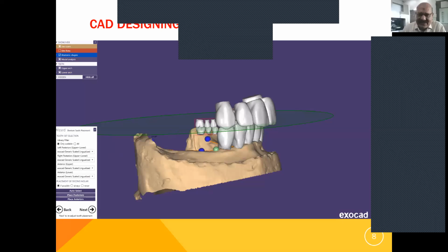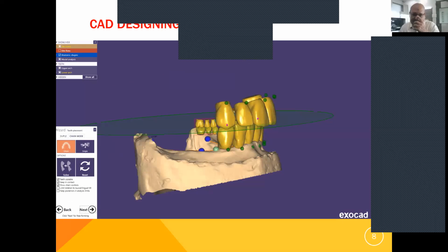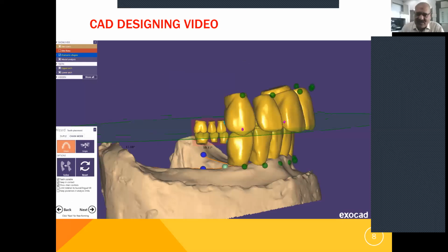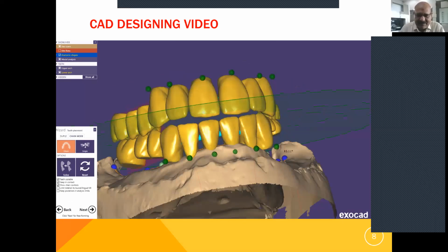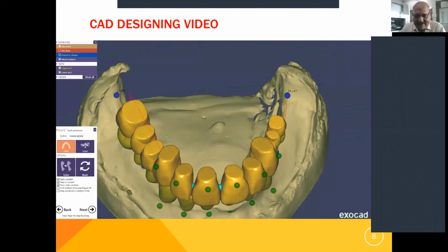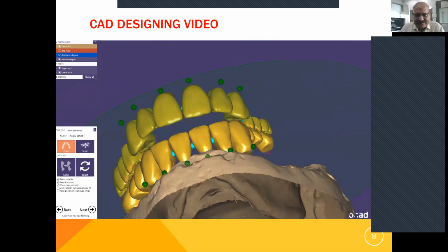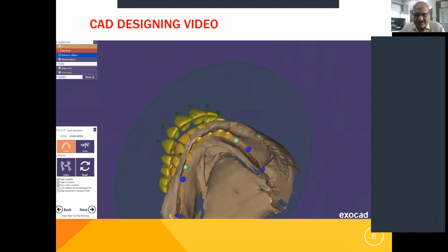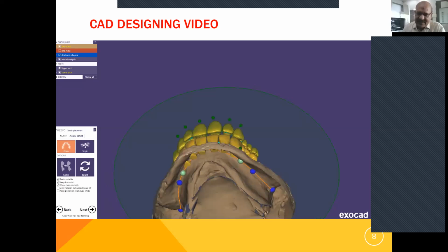Now it is interesting to note here, doctor, the distals, premolar and molar, the group of 3 and 3 on either side each, cannot be moved individually. They have to move in a group. So I'm just enlarging them to bring them to their normal size, and bringing them into occlusion.